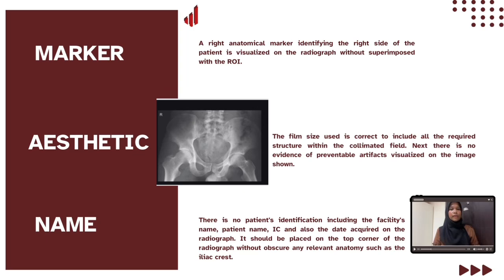And the last one is name. There's no patient's identification, including facility's name, patient's name, IC, and also the date acquired on the radiograph. It should be placed on top corner of the radiograph without superimposing the anatomy region.